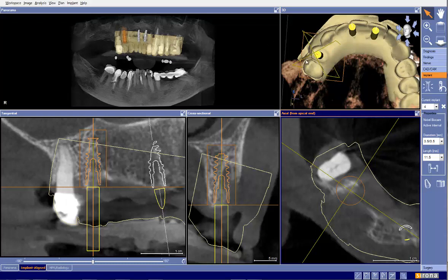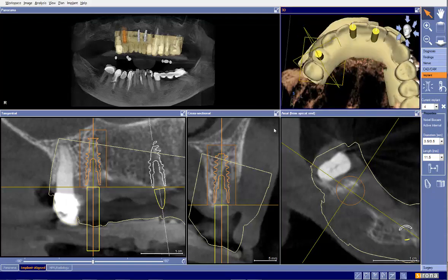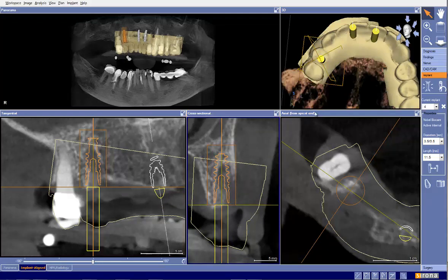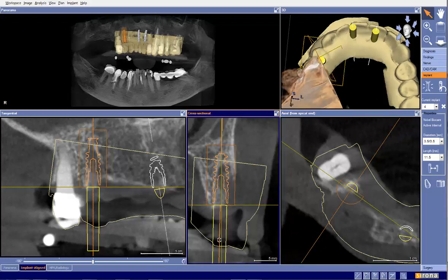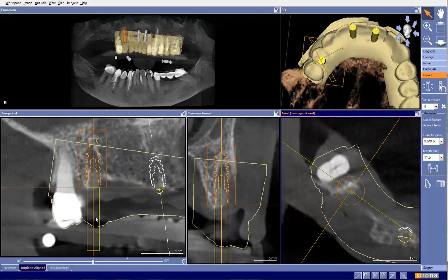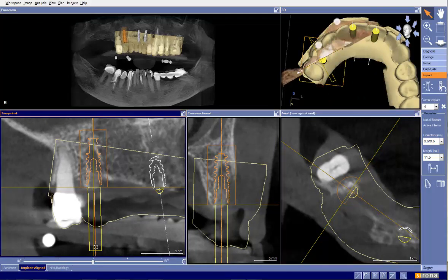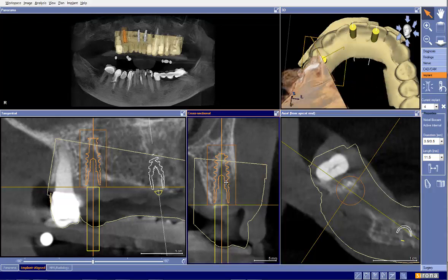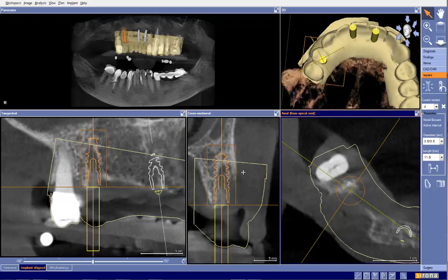And also, if we go back to number 5 here and where I would like this implant to be placed, I'm just going to grab the head of the implant, the base of the implant here, and I'm just going to tilt it, tilt it, tilt it until I'm just coming out the lingual cusp of tooth number 5 there on the partial. So now I'm starting to be a little bit more comfortable with my placement in the sense of location for the locator abutment, just like so. So I prefer this location for my locator abutment here. And there we go. So again, be prepared to graft this site if this is the site that we choose to use.